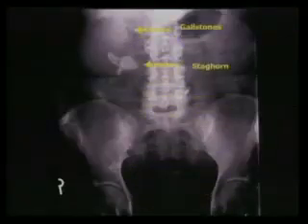XGP, xanthogranulomatous pyelonephritis, especially Proteus mirabilis. These are other calcifications that are in the kidneys. Guys, this is the psoas shadow. This is degenerative changes, degenerative disc changes. So you can see multiple calcifications, gallstones, the staghorn calculus, and other renal calculi.